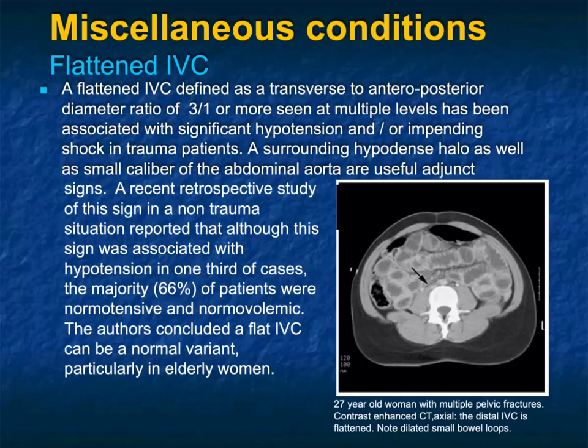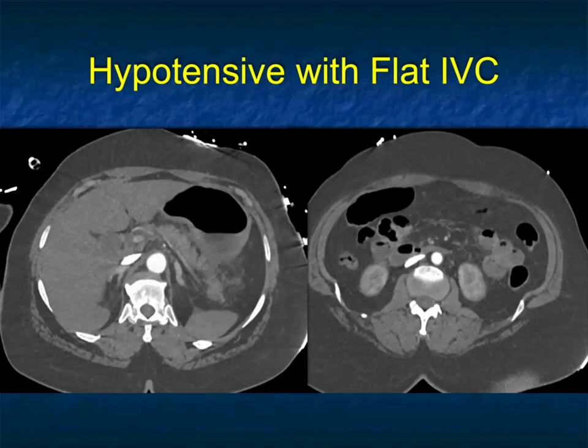It's not just in trauma patients, but in any patient who's hypotensive, we can see this. Occasionally, a flat IVC can be a normal variant, particularly in older women, but that's uncommon, and you better make certain the patient isn't hypotensive.